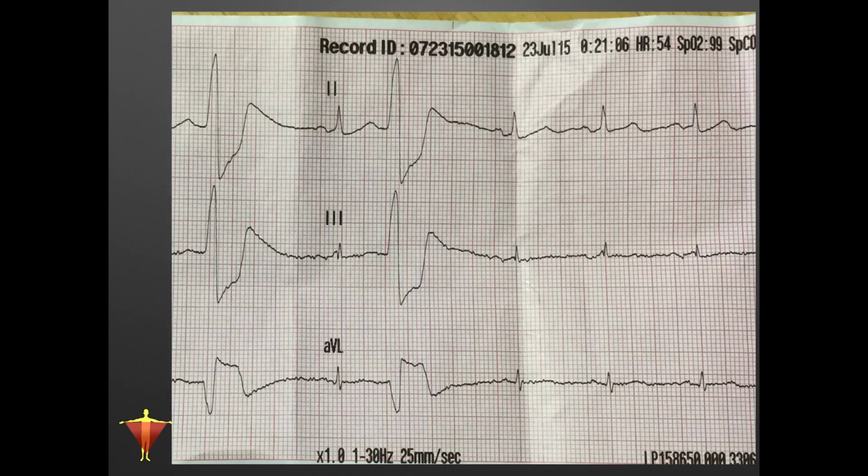Cool. So we take a look at this QRS complex. Now, we have three on the right that, well, those look alike. But then we get these two big ugly things on the left side. Now we can see that they're very, very wide, right? Because if we go from the beginning of this QRS complex here to where it comes back to baseline here, well, that's really wide. That's almost 2 boxes wide. That's not right. But the rest of them seem like they're doing okay, right? This QRS complex looks like this one looks like this one. So we identify these as just premature ventricular complexes.